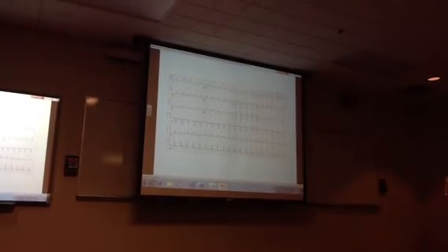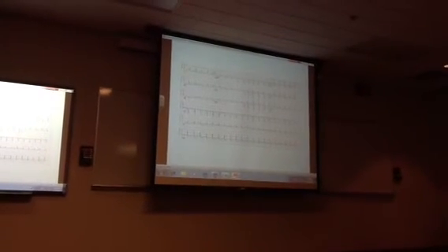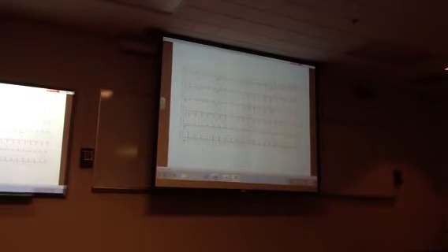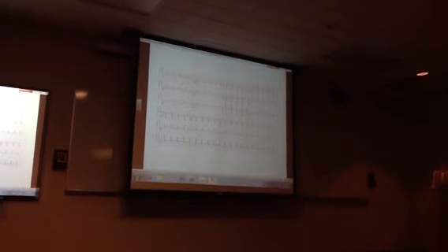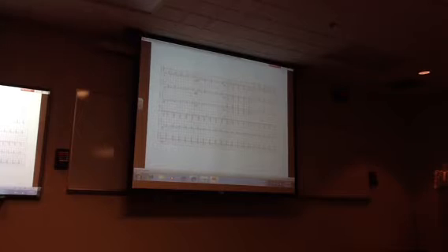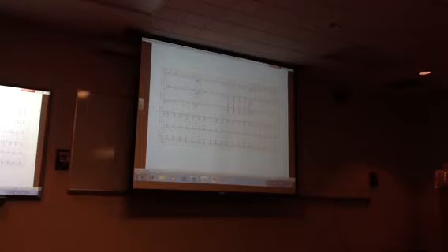Prostatectomy. Whenever you work with patients in your third and fourth year rotations on surgery, you're going to have pre-op studies: blood tests, EKGs, x-rays. This is this fellow's EKG before he's facing prostatectomy, and you're on the cardiology service, and Justin is on the surgical service, and he doesn't want to send this guy to the OR because he's worried about his EKG.